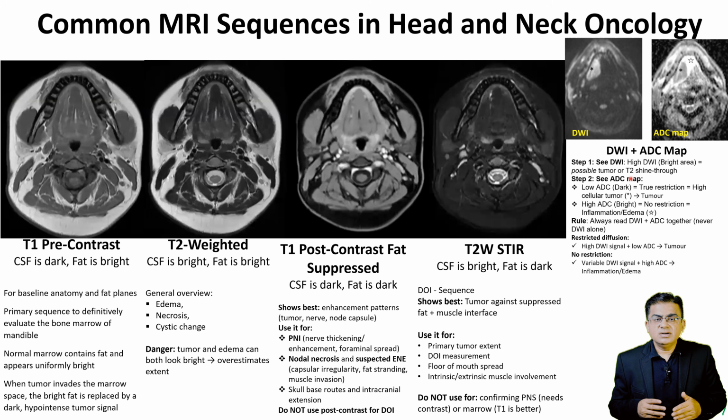These are four sequences of MRI you need for head and neck cancer. Here is the exact clinical breakdown of the four sequences on your monitor and exactly how you will use them. For beginners, I will tell how to find which sequence is which.